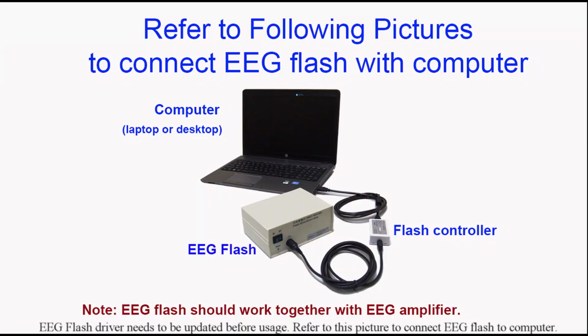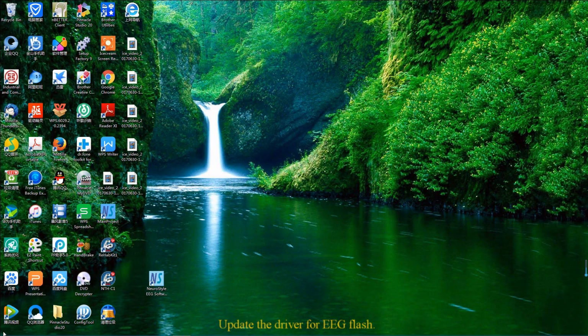EEG flash driver needs to be updated before usage. Refer to this picture to connect EEG flash to computer. Then update the driver for EEG flash similarly.